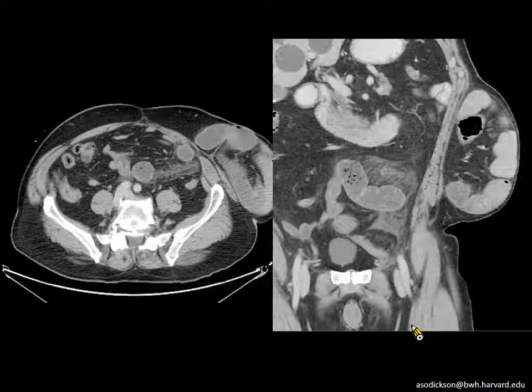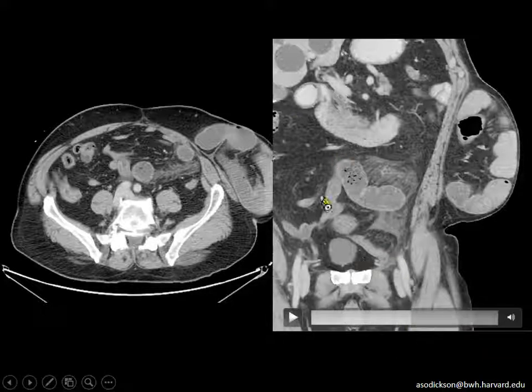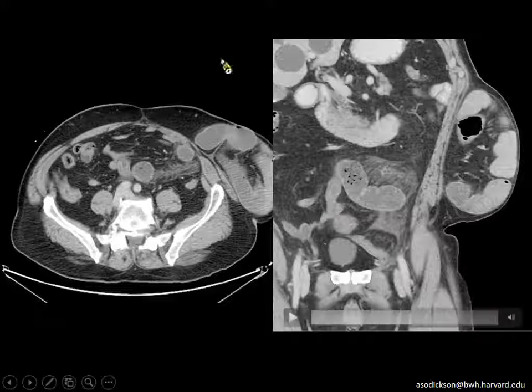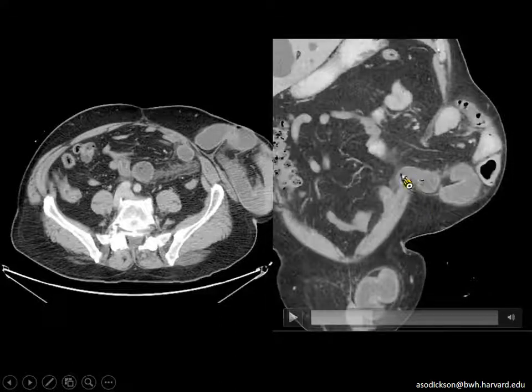Most common causes of a single transition point bowel obstruction are adhesions from prior surgery, or occasionally from other inflammatory processes that have happened previously in the abdomen. One thing that's helpful to think about here, this is a bit odd. I don't see a very tight narrowing to suggest an adhesion, and I see this unusual edema pattern in the wall right there. And what I actually think happened here is that this area of bowel was likely impacted on the wall of this large ventral hernia right here about an hour or so before the scan.